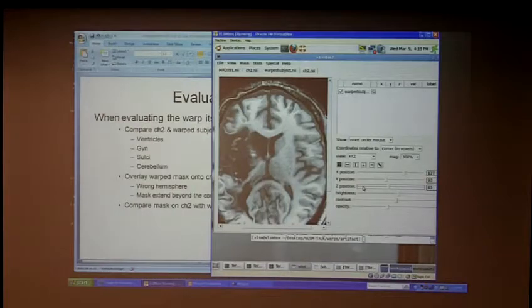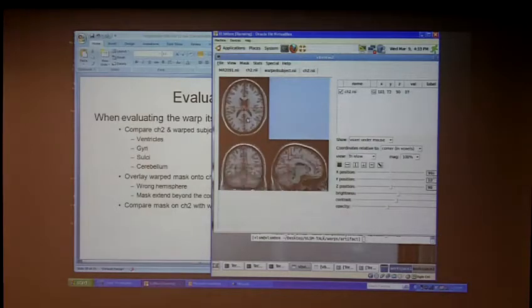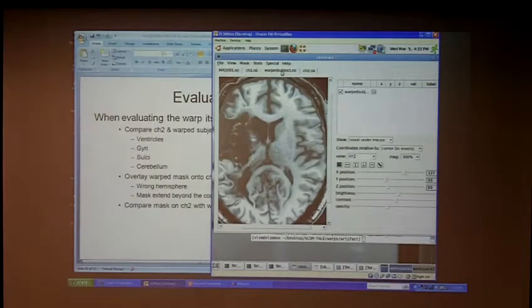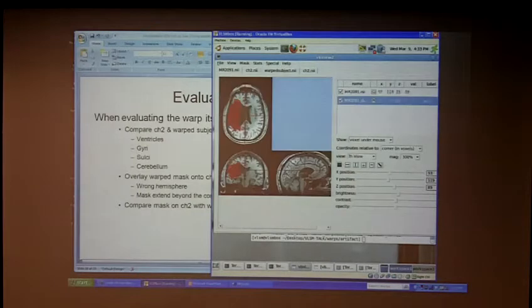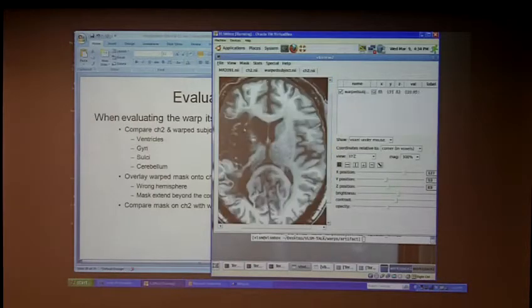So, of badness, this I wouldn't necessarily consider too bad, just because I think with that lesion mask, it's essentially ignoring this level of cortex, and so it's saying that, presumably, if this person's brain is intact, this piece of cortex would be here. And so it actually now has to figure out where it is going to put this distortion. So it's assuming that it doesn't exist, if you will. So at some level, I'm not too worried when I'm looking at this particular one.